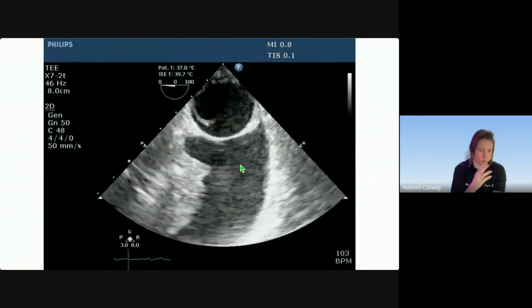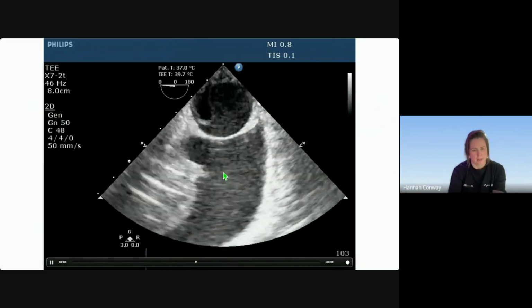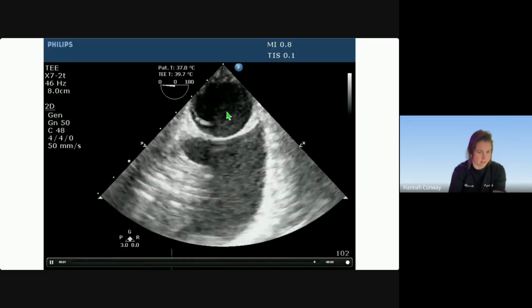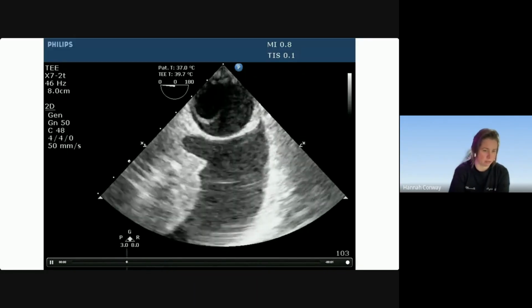I'll talk to you a little bit about left pleural versus right pleural. Obviously, this patient's got a dissection. The reason I know this is left pleural is because A, it's got the descending thoracic aorta in the view. You wouldn't see the aorta with a right pleural effusion.